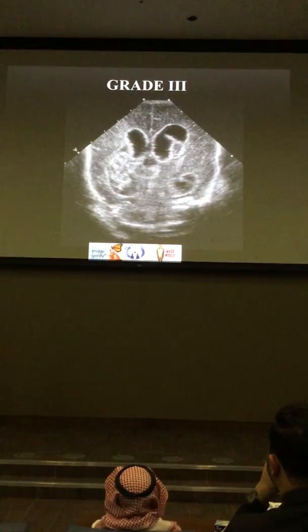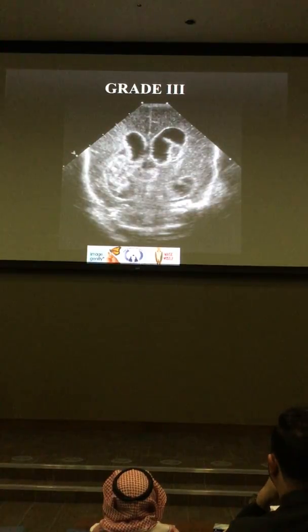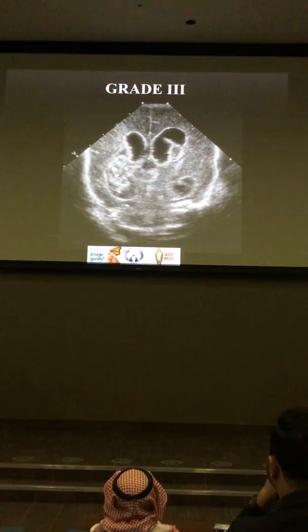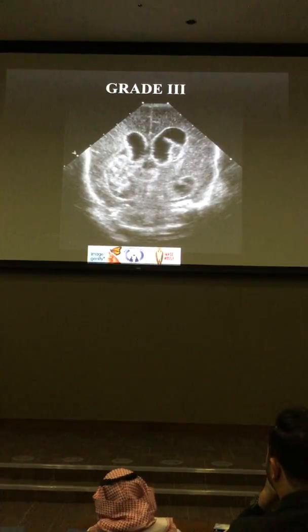There is increased echogenicity of the ventricular wall. Good. And bilateral enlargement. Good, thank you very much. Yes, so echogenic wall of the ventricles, right? So this is like a chemical ventriculitis from the hemorrhage. Common things we see. So with hemorrhage, you will sometimes see echogenic walls.